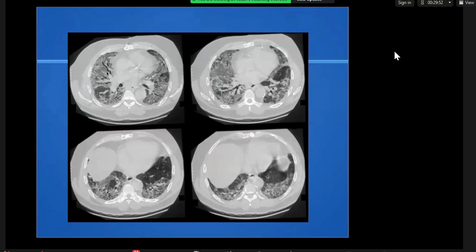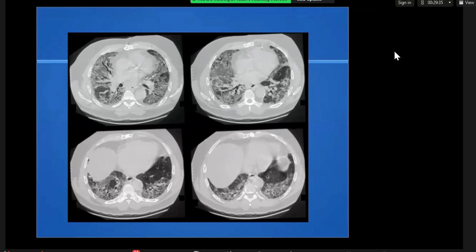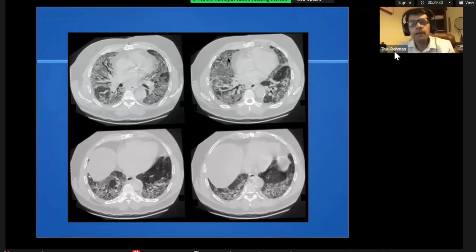Very good, traction bronchiectasis. So if you see this degree of ground glass, you may be unsure whether that's an acute alveolar process. But when you find traction bronchiectasis, those are the arrows that I'm showing you. Yeah. Dilated bronchi everywhere. So peripherally distended bronchi, traction bronchiectasis, suggestive of a diffuse interstitial scarring process that is shrinking the lung and distending the airway, which is quite characteristic of UIP.